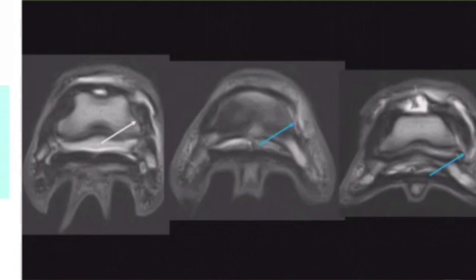and the image on the left-hand side of your screen with the white arrow is proximal. So that is the part that we can ultrasound and the part that corresponds to what we saw on the ultrasound. So here again, there's that fossa. Here we're at P2. But as we come down distally, the injury is actually much worse. And as we get down to the insertion where this blue arrow is, there's essentially maybe just a few little ligament fibers hanging on for dear life, and it is otherwise completely torn.